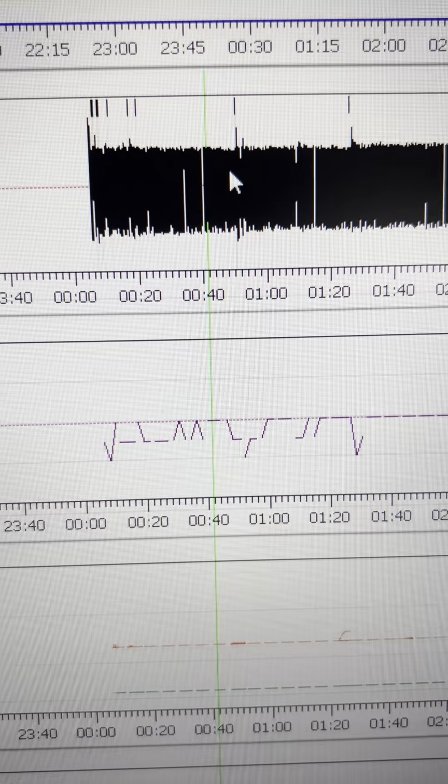That's how you can see a lot of things. So here I'm trying to breathe quicker because I'm probably not getting enough air volume in for some reason. So I can't really show any pictures of where I'm under ventilating, I think. Maybe on one of my first days with this machine, like right here. This was one of the first days.